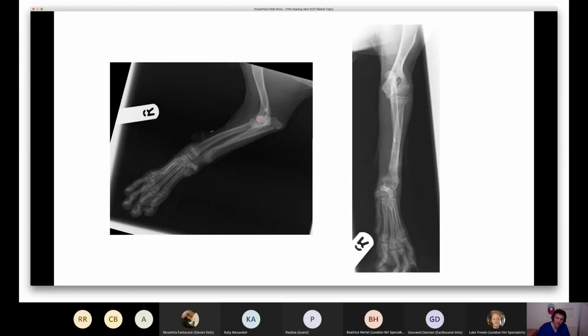So I think it's this physis here that's masquerading as potentially a little fissure, looking a bit like an unattached anconeal process. But no, good spot. I think you're absolutely right to ping that. And yeah, describe it and have that on the differential list.